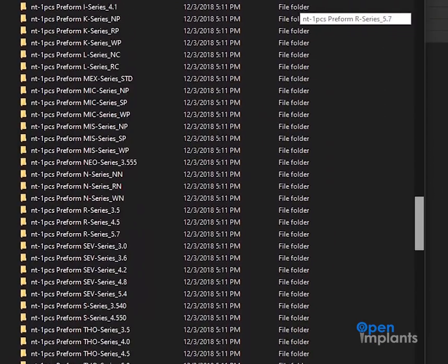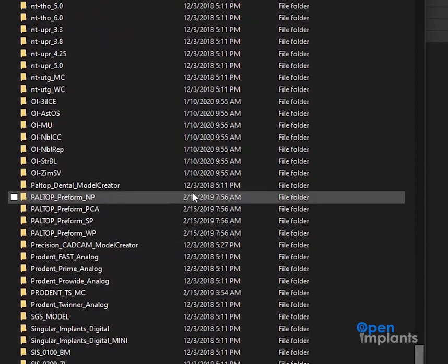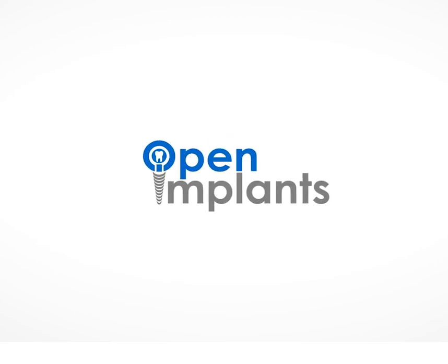And then just to make sure, I'm going to go back and double check and make sure that they were in there. And there we are, Open Implants. If you have any questions, please give us a call. Thank you.